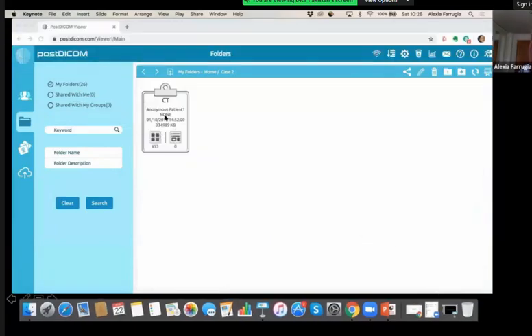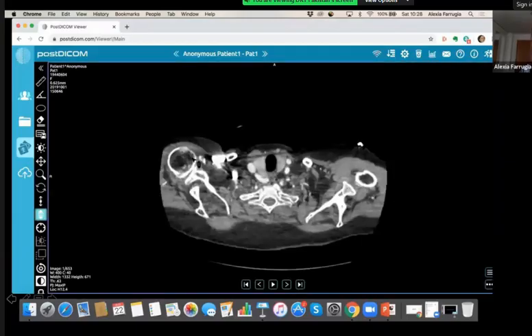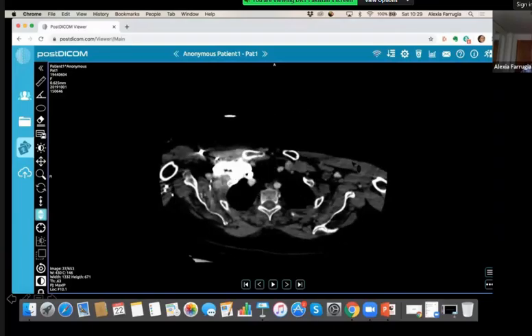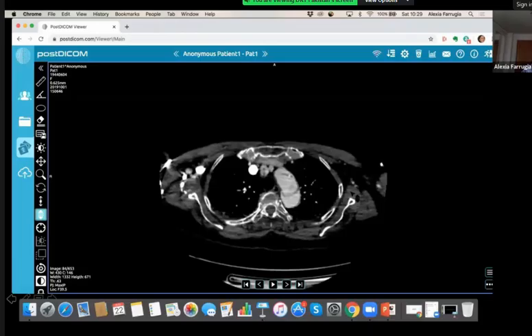And we did a CT for this lady. Okay, I'm just going to window it slightly for you. I'll just scroll through, and then we can go through it again slowly, and you can describe your findings.